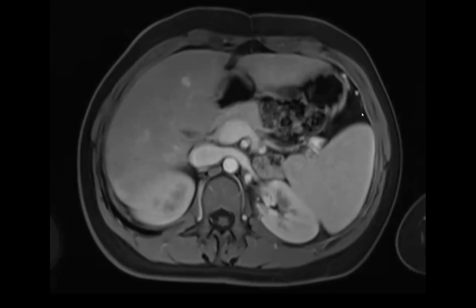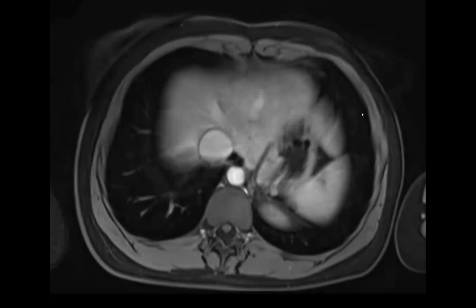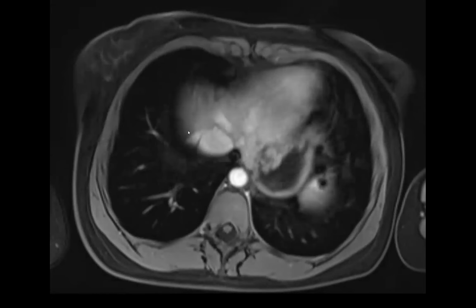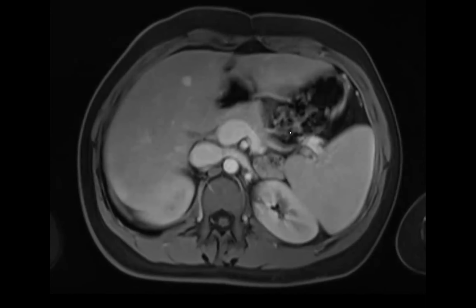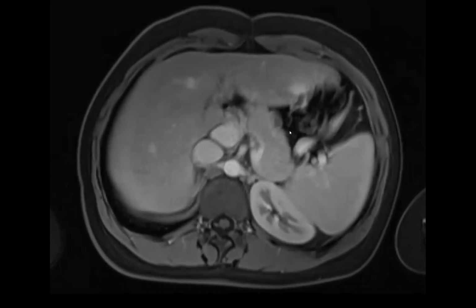Those hepatic veins, are they going to the right spot? Can we scroll a little higher? The hepatic veins are going to the right spot. They're going to the IVC here. But there is something weird about the portal vein. It's like an anomalous. Yeah, it's going directly into the IVC.